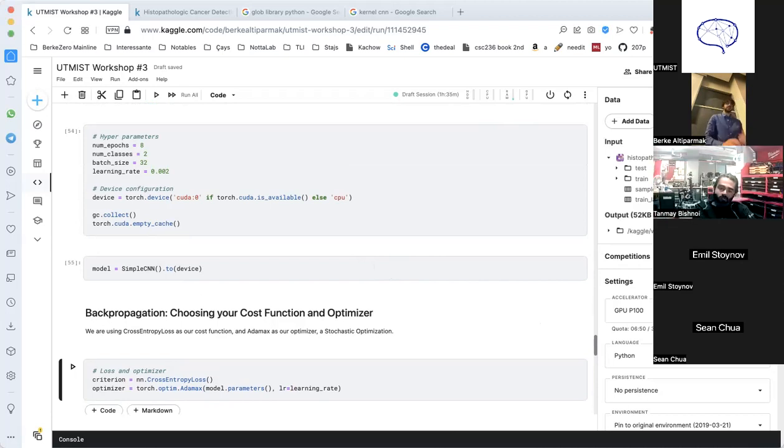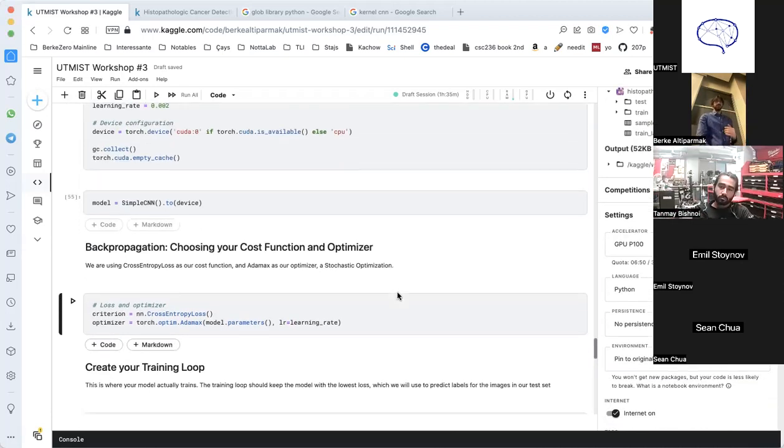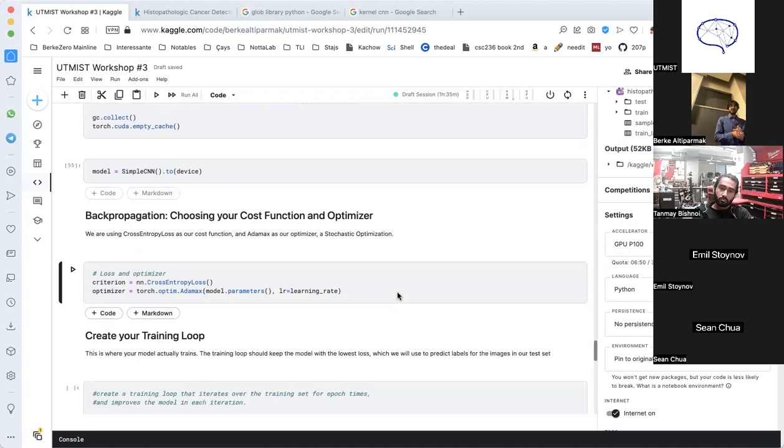And as I said, backpropagation allows you to improve your model. So we have some optimizers provided by PyTorch. And Temme is getting a kernel size unexpected keyword argument error. So you wrote kernel, it should be kernel_size. So if you change that as well, make it kernel_size.